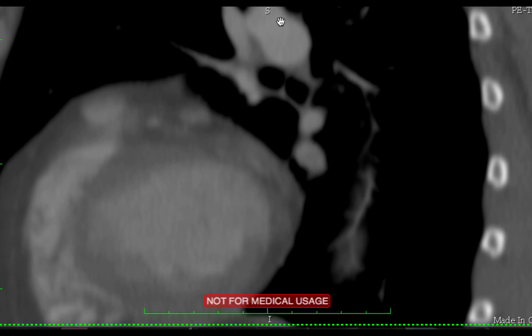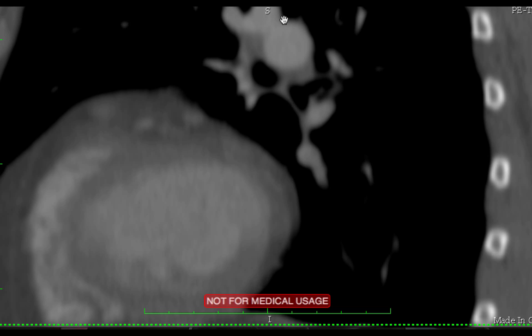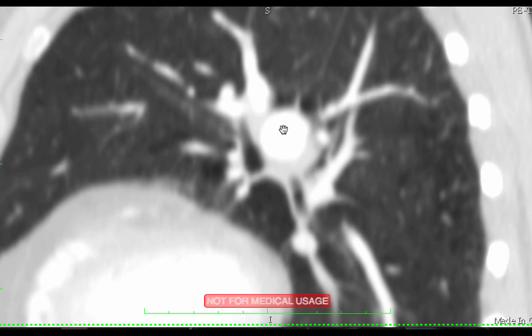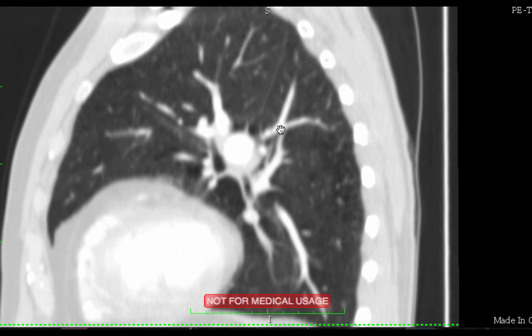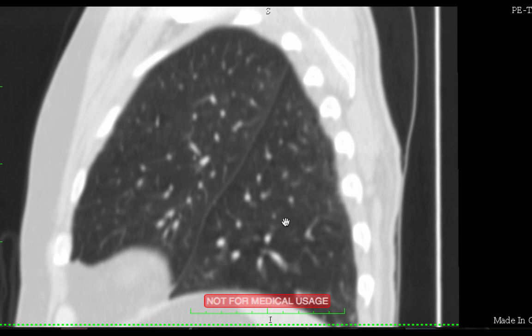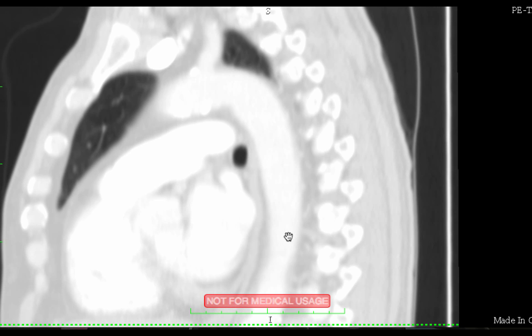It kind of dives backward more. And then we follow this to the left side. And what do we have here? We have two lobes, left upper lobe, left lower lobe. This is the major fissure. There is no minor fissure, and there is no middle lobe on the left. So you have left upper lobe, left lower lobe, and this is where all the oxygenation takes place.